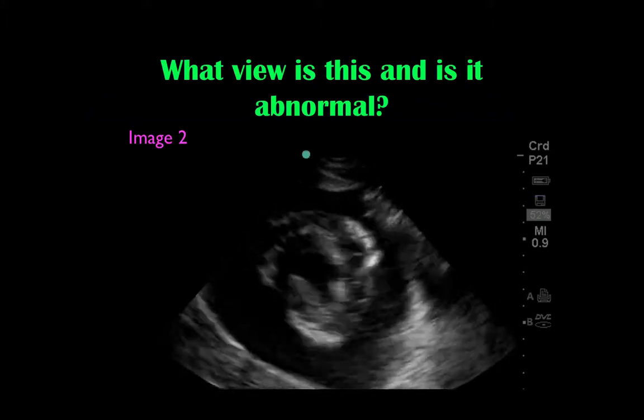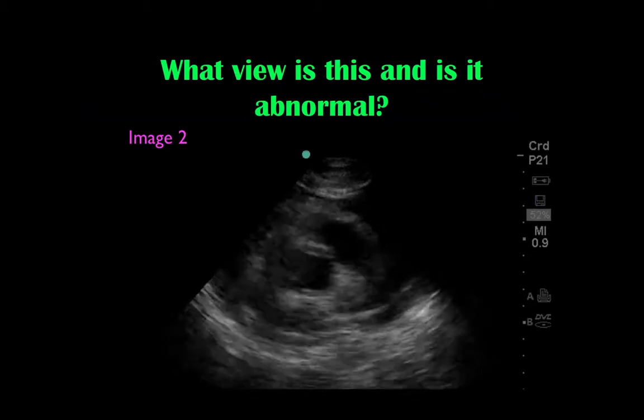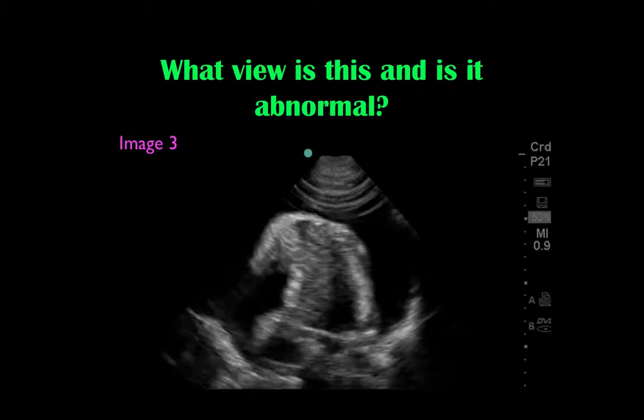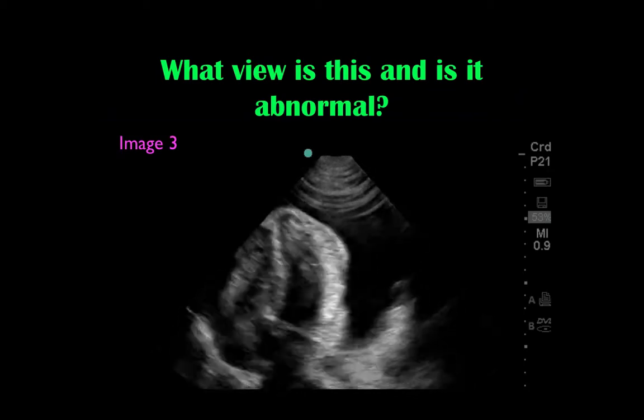And once again, we'll take a closer look at the heart by having additional imaging. Here's image number 3. What view is this, and is there any abnormality?